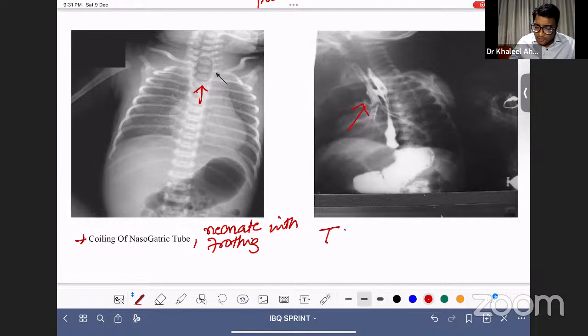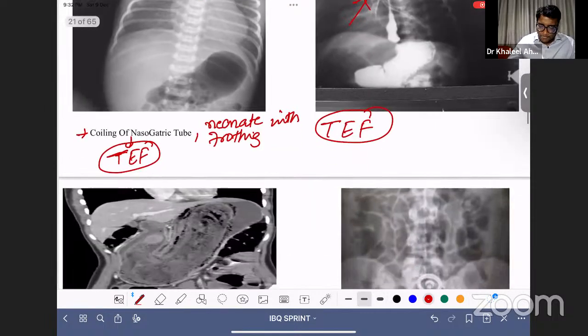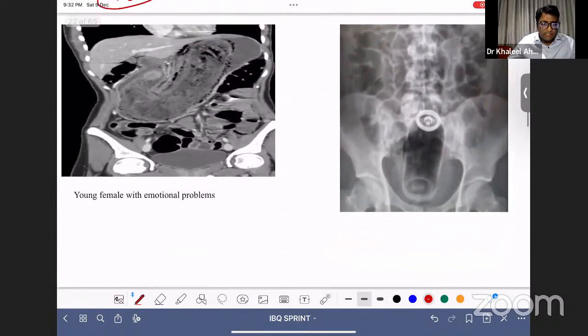This is tracheoesophageal fistula. So either a radiograph may be given, or they can give you the barium study showing the opacification or contrast entering into the tracheal tree. This is tracheoesophageal fistula. Remember both the images, how tracheoesophageal fistula will appear on the radiographs and on the barium study, right? Next one. Okay. Try to answer this one.